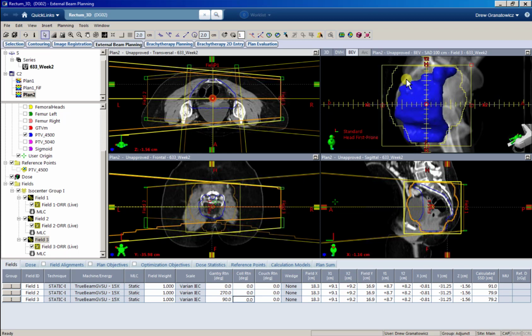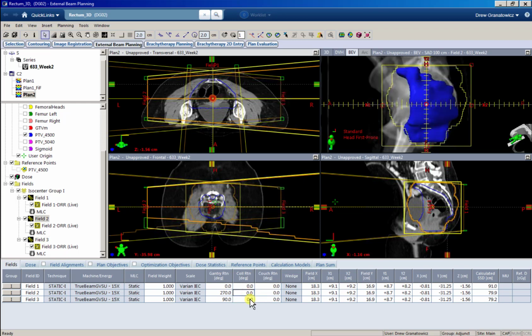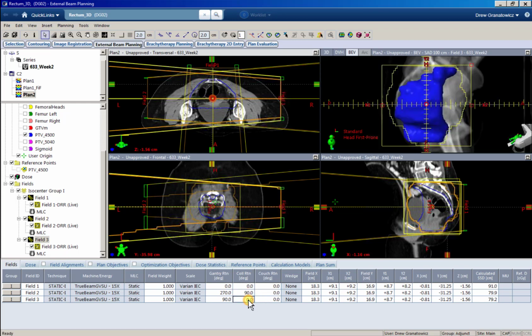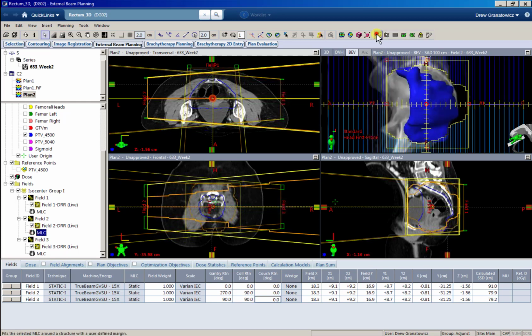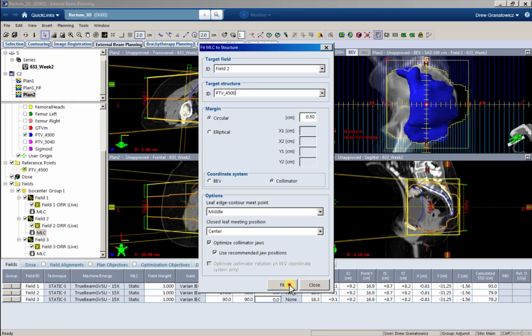And to do that, remember our EDWs, the heel and toe only go in the Y jaw direction. So we don't want to push dose superiorly or inferiorly, we want to come the other way. So in order to do that, we need to rotate our collimator 90 degrees. And then watch what happens.